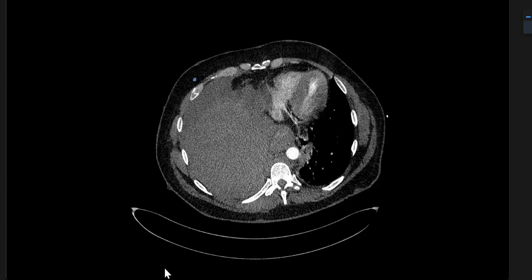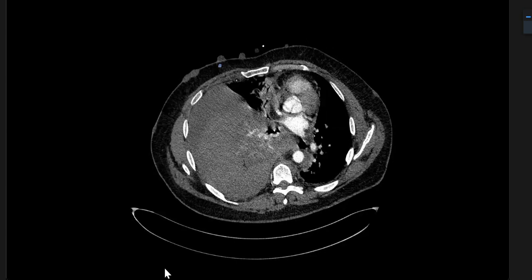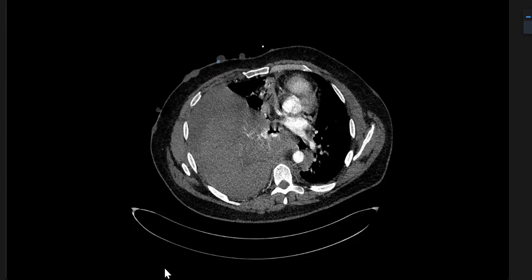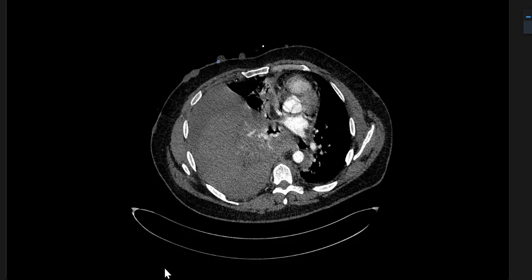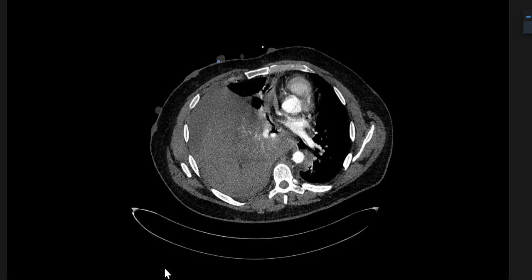Can you see that? Those nodules were evident on the chest X-ray as well. Very subtle though. But here they are, you can't miss it here. So these are neurofibromas. So the patient has got background neurofibromatosis. Probably one of the neurofibromas was on the pleural surface, and then it just eroded into one of the arteries. That's the assumption. This is my case.